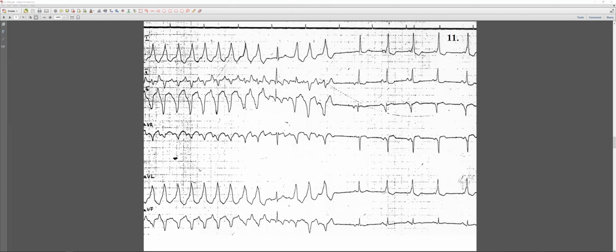Left part, yes. Okay. Yeah, so this part is quite rhythmic. For me, it looks like a bit tachycardic, about 150. Okay, that's tachycardic. I can see like a wide QRS.